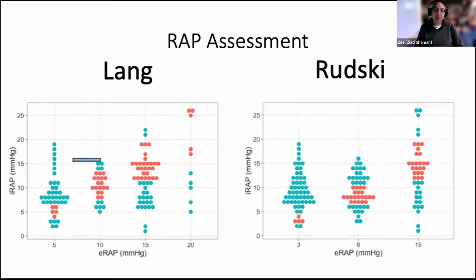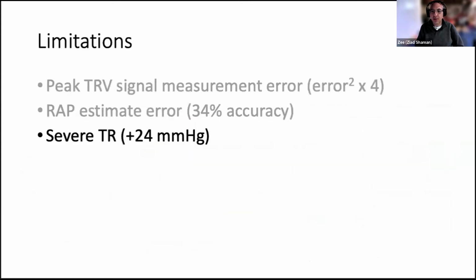So we look at the IVC, we like the IVC. I look at the IVC all the time to predict if the patient requires more volume. But in the back of my mind, I'm thinking about all of these people here where I think the right atrial pressure is low, but the person is probably overloaded. So combine this with looking at the LVEDV if you're assessing the clinical status of the patient.